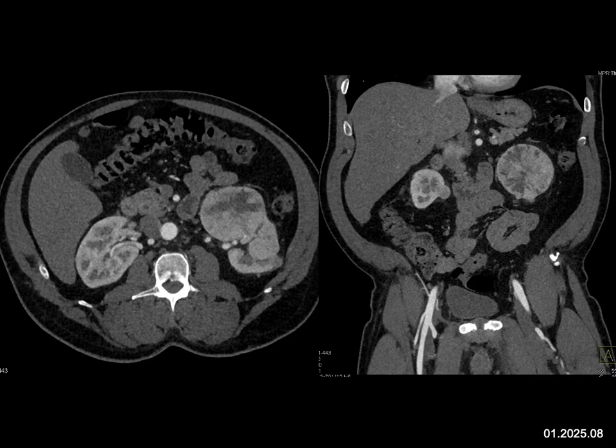But what I'm also asking you is the appearance of that lesion, which looks spoke-like. And typically with a clear cell, which are hypervascular, you can see some necrosis, but this looks more spoke-like. Melanoma metastatic can involve both kidneys, but typically hypovascular. Papillary renal cell is typically solitary and hypovascular.